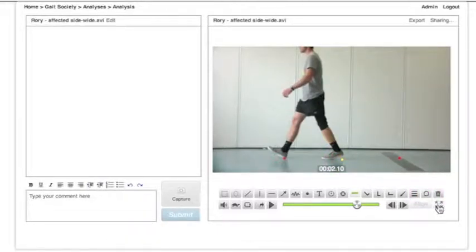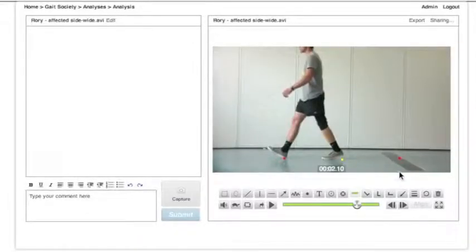undo that because I wasn't happy with that measurement, and I can also go to full screen to take a better look to make sure that I can see the dots in full view. So using my points as reference for my start and stop point for my lines, I take one measurement and then I take the second measurement as well.